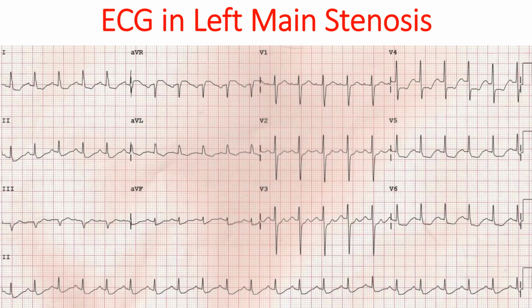ECG in a person with persistent anginal pain for the past several hours showing significant ST segment depression in anterolateral leads along with sinus tachycardia. ST segment elevation is noted in AVR. Such a pattern is consistent with significant left main coronary artery stenosis.